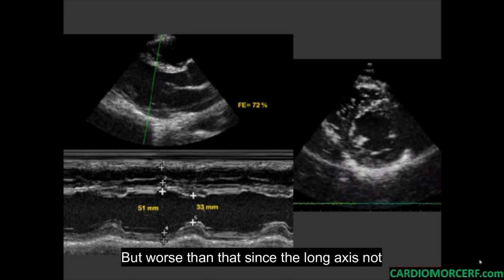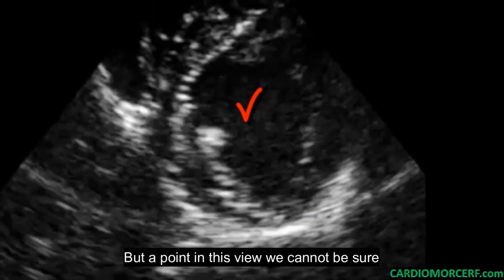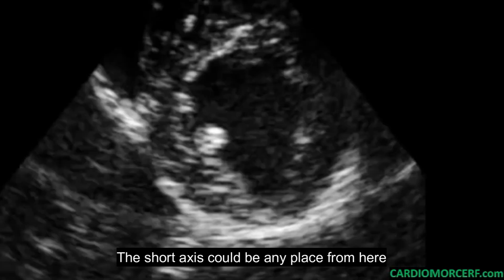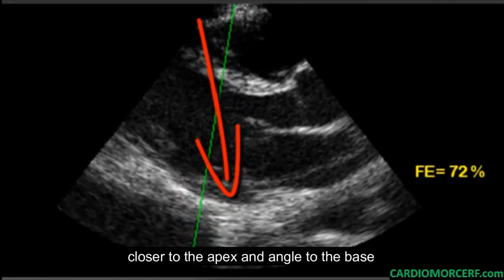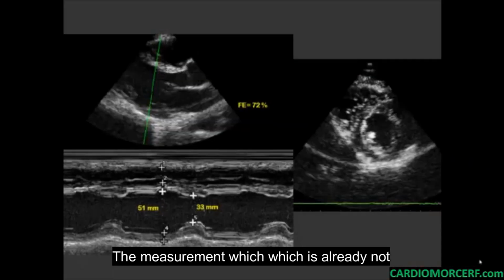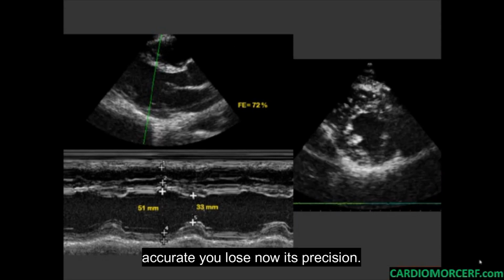But worse than that, since the long axis is not a line anymore but a point in this view, we cannot be sure how angled it is about that line. The short axis could be any place, from here closer to the apex and angle to the base, or there, close to the base, and angle to the apex. The measurement, which is already not accurate, will lose now its precision.